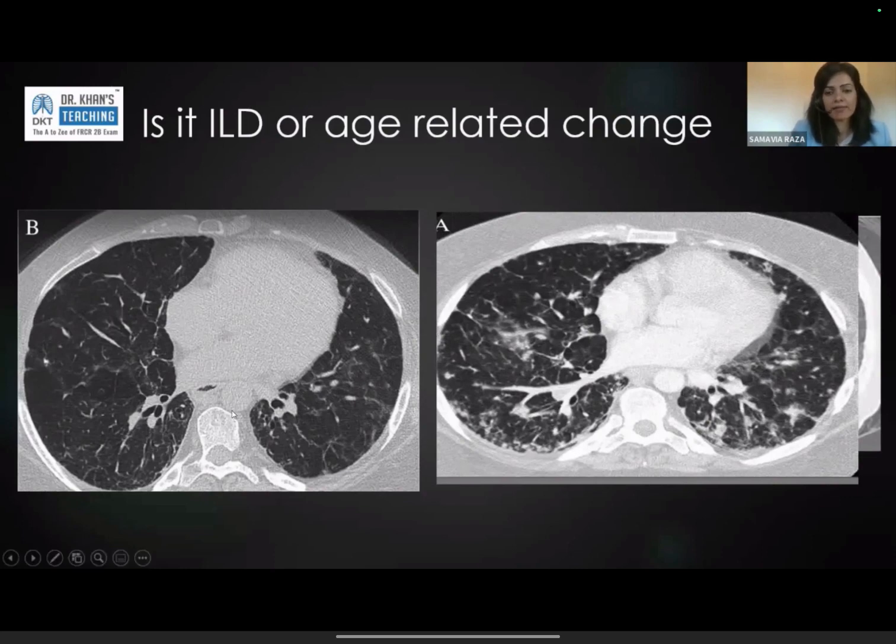And the only test in reality is follow-up. So when you see these patients followed up, if they actually had no symptoms at that point, it would not be unreasonable to recommend a 1 year follow-up. If they came back in 1 year and they ended up with a scan like that, you know they clearly have ILD and it is progressing. If this was the initial scan, you would be way more confident calling this ILD. But on the first one, depending on the age and the patient presentation, your report would be tailored according to that.